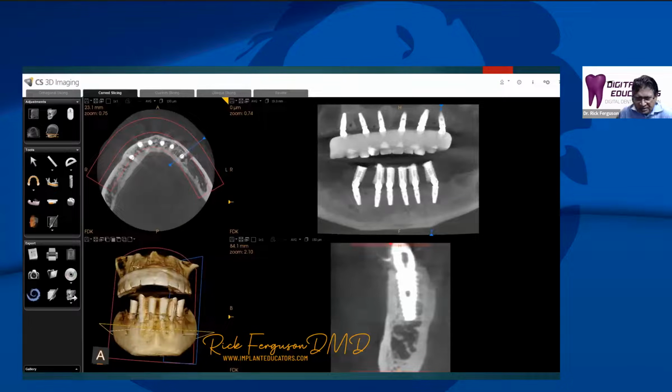I did do that one myself, but it actually looked pretty close to his original teeth from before. He wanted more squared off looking teeth, and that's what we gave him. So we used that design for the outcome that we tried to achieve in his temporary prosthesis.